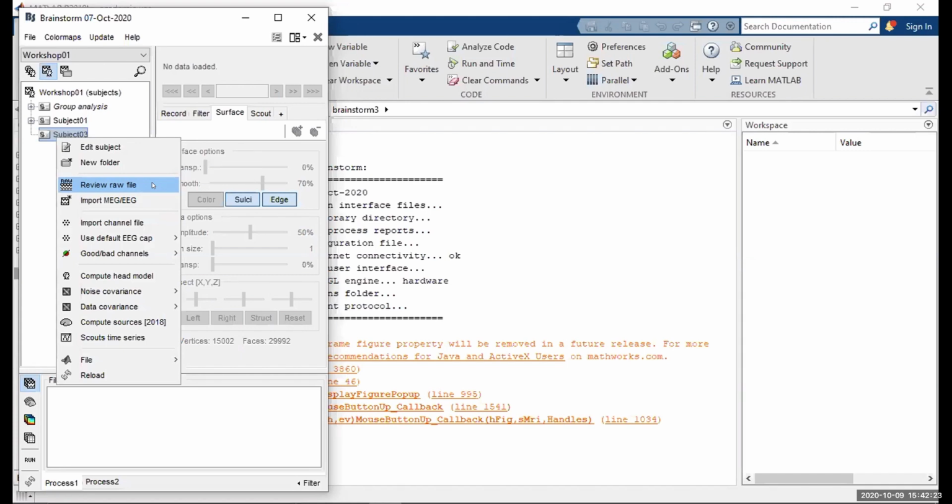Whenever you're working with raw files in electrophysiology, as you'll know if you've worked with it in the past, these files can get very long very rapidly, right? Whenever you have somewhat of a long recording, the size of the file will get very huge.